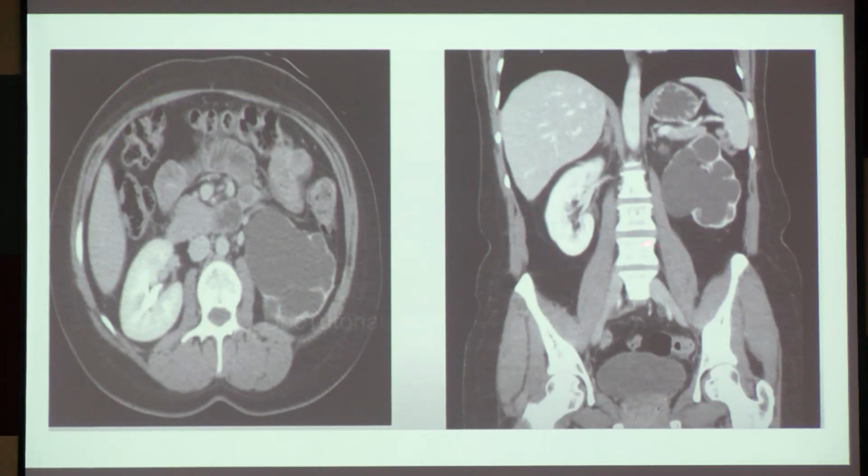This particular thin rim outline is called a rim sign. R-I-M, rim sign. The rim sign is seen in patients who have chronic hydronephrosis. This chronic hydronephrosis can be because of a UPJ obstruction that I just told. So it can be a similar finding. Second, this similar finding can be seen if there is a chronic obstructing stone at any length of the ureter, whether it is PUJ, anything. So you will never comment this as a UPJ obstruction. You will always say this is a chronic hydronephrosis, which has led to a thinning of the cortex leading to the cortical rim sign. Okay?